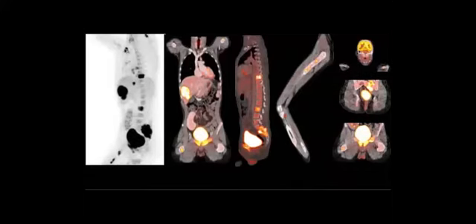This is a 16 years old patient, still pediatric, and he presented with weight loss and pain. He even did MRI and FDG PET-CT for staging, and they found this left iliac fossa mass with soft tissue, as we mentioned. Yeah, it can be metastasis. Now it is time to mention the differentiation. It can be metastasis, then the tricky part will be what is the primary? Okay.